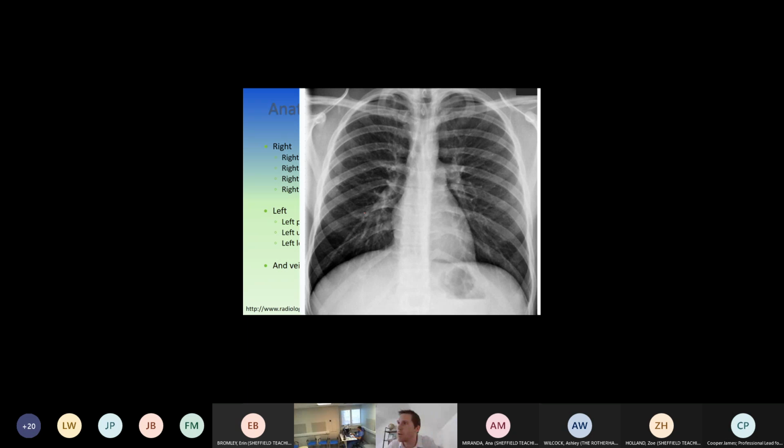They're filled with fluid. So all these white lines, they're all blood vessels. All of these blood vessels come from the hilum. So the only thing that we should see in the lungs is blood vessels. We shouldn't see anything other than blood vessels. And as a general rule, all these blood vessels originate here and here. So they should all run roughly in the same direction away from the hilum. So you can see they do in this normal chest X-ray.